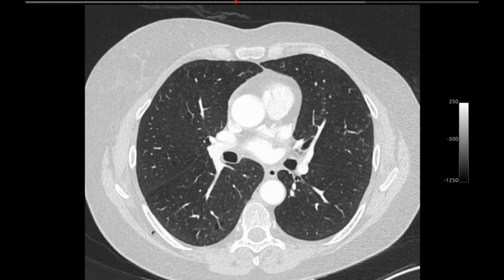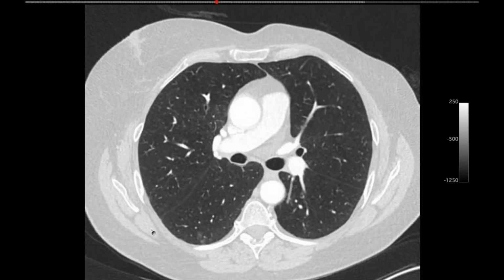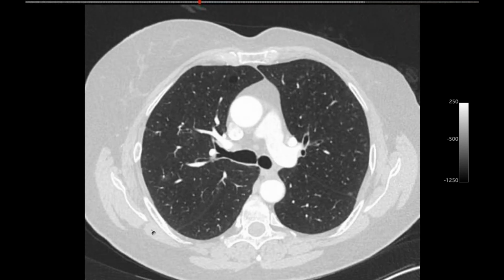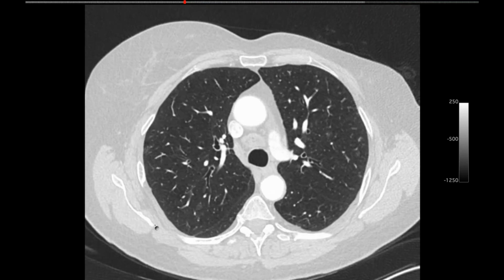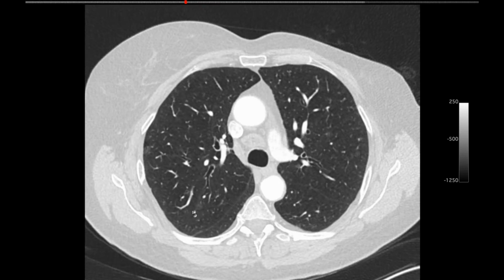And I'm sure you've all seen these in your tumor boards, where they treat one and then you have to decide what to do with all the other ones and when to act. But I've never seen one with this many separate ones. This has got to be, I don't know, 30, 40. If you scroll through a case like this, you can start to imagine that you're seeing maybe not even dozens, but much more than that.